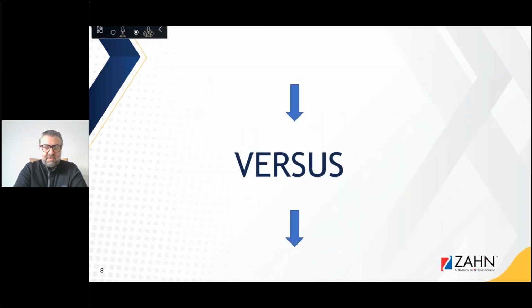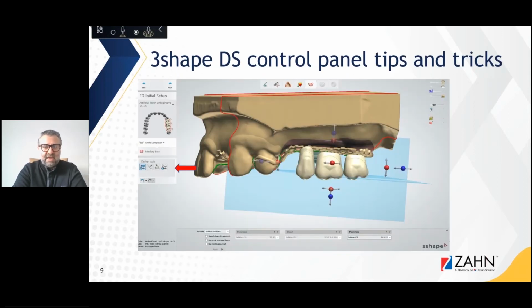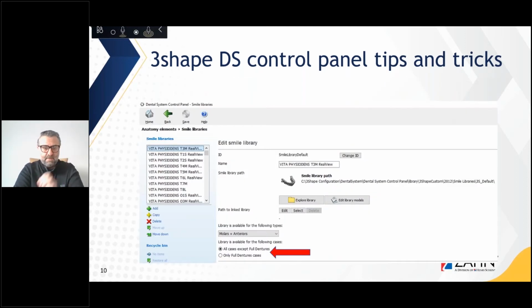And this would be when you don't have that option enabled. It will simply come in when you apply your library and stay like that, with no option of actually morphing, adding, or even smoothing your teeth.